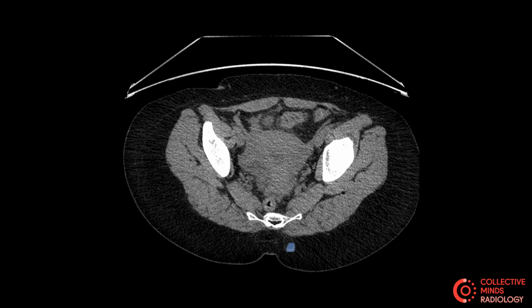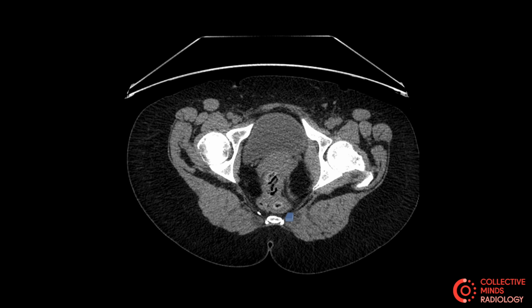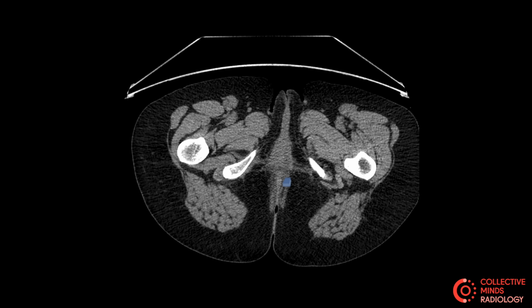So running out of things that could be causing upper abdominal pain, think about things that are common. So now we have to go through the bowel, literally chase through the bowel. Going through the bowel means that you go right down to the rectum, which is over here, and you follow the bowel. And now you're going to maybe hear my mouse scroll away as we go through this.